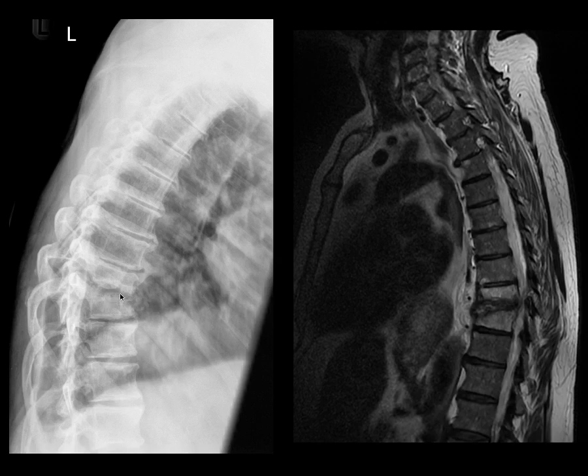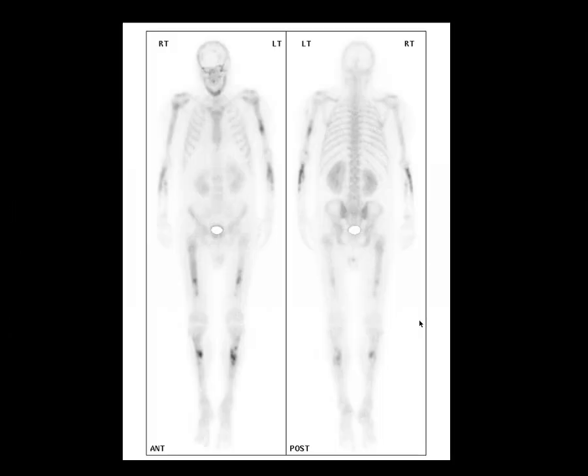site of the abnormality. There isn't really much fluid in the disc here on MRI. There is some sort of edema or some kind of change in this adjacent bone marrow here, but the patient didn't have many symptoms, so this was assumed to be chronic discitis, and in fact on follow-up MRI it didn't change very much, so no biopsy was performed.